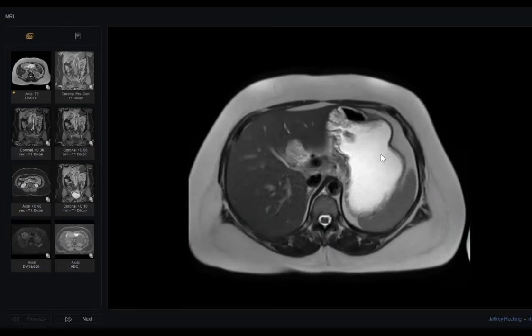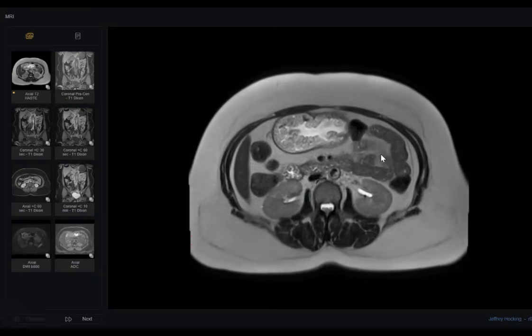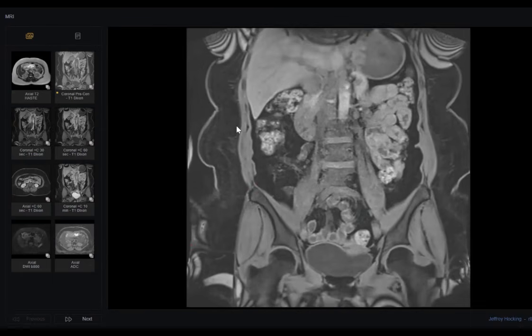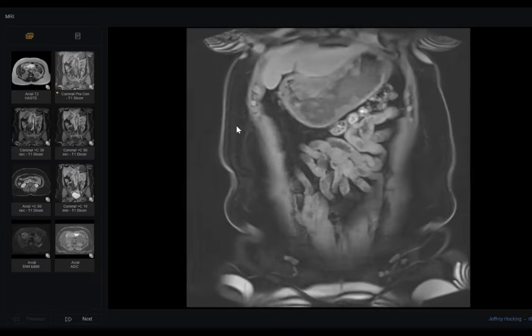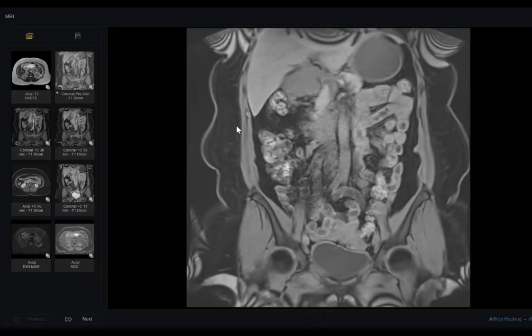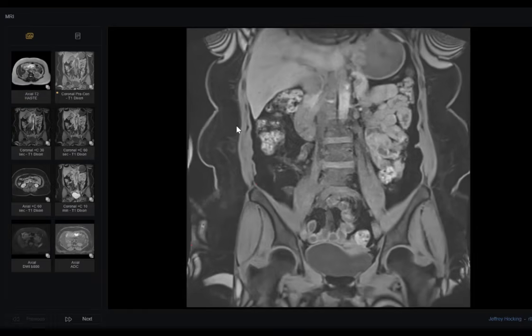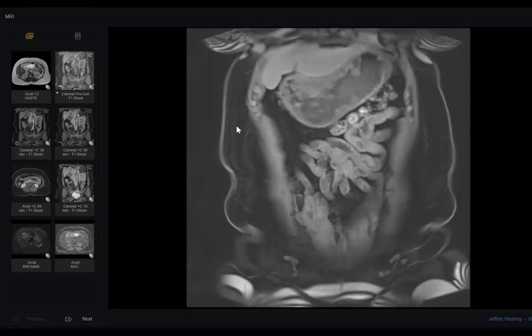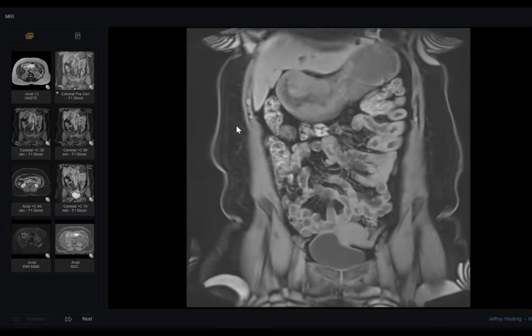What about benign causes? The stomach and the duodenum are among the most common sites of adenomas, polyposis, polyps. Could this one be multiple polyps or multiple adenomas?